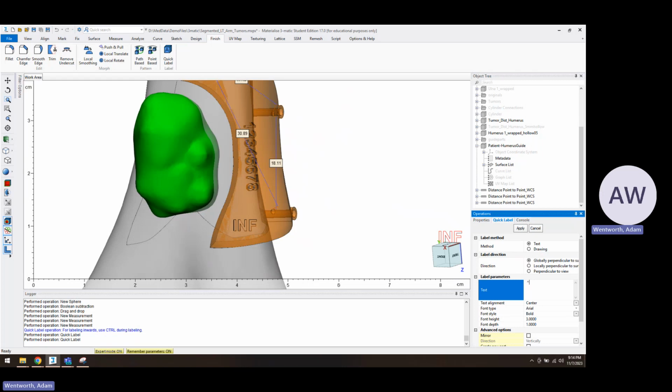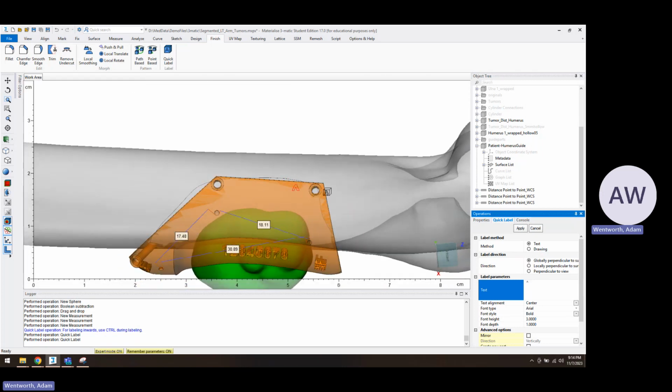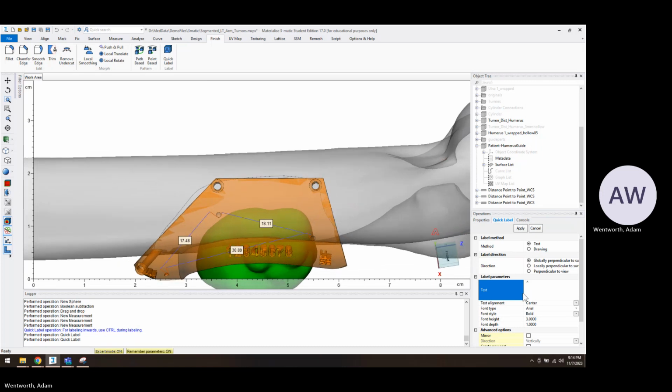We might also put these carets which tell us which sides are going to be cut, a little indicator that says cut. If your label doesn't change, just hit enter. Do that a few times here.